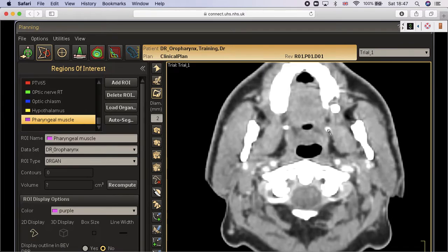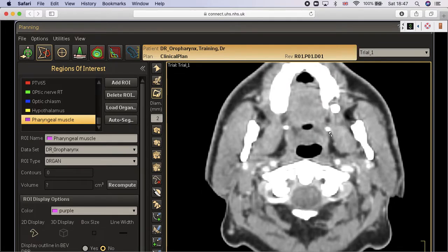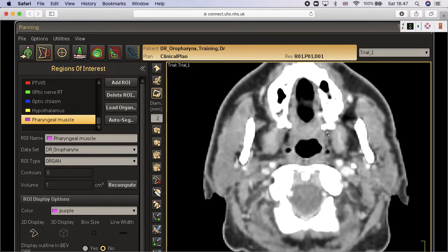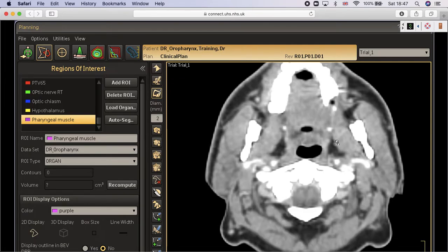And we all know the pterygoid plate is part of the sphenoid bone, and that's why I'm using the words sphenoid bone hamulus. I'm just trying to make it simple, for me at least. So the hamulus of the sphenoid bone will be the starting point for the pharyngeal muscle.